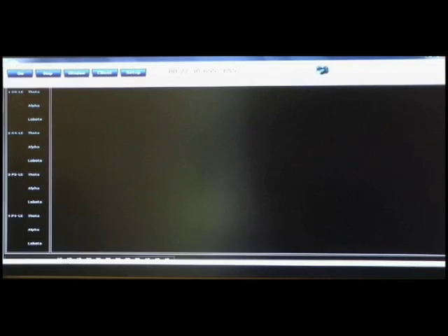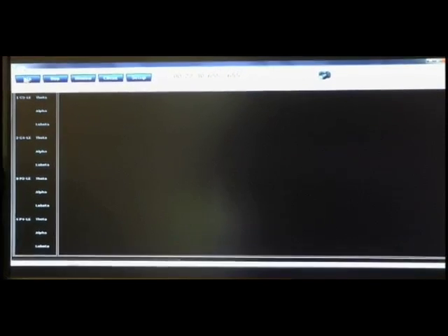So from here, we see our training channels: C3, C4, P3, P4. Okay. So I'm going to go ahead and hit go. As I hit go, it's going to say unable to open COM port because I do not have a device plugged in. However, I have it on simulation. So I hit yes. It's going to say ready to start.